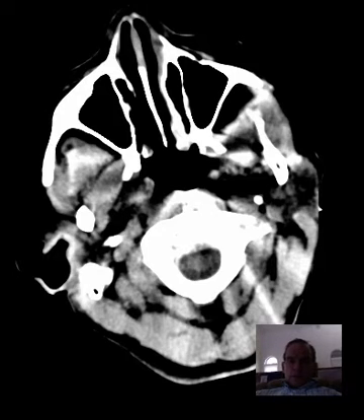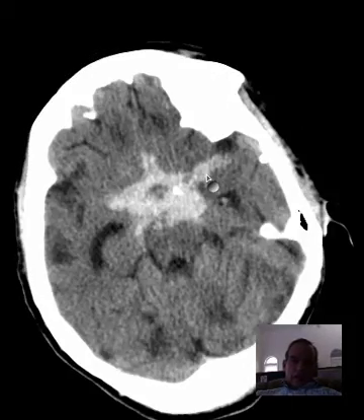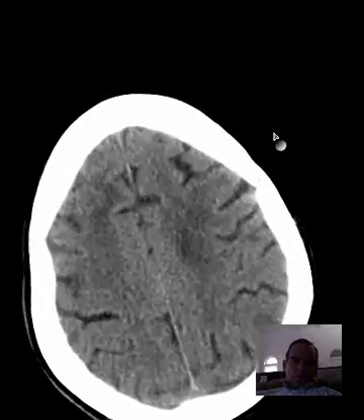Hello there, this is Dr. Mintz. This is an elderly female who had a sudden onset of severe headache, lost consciousness. So what do you see here?